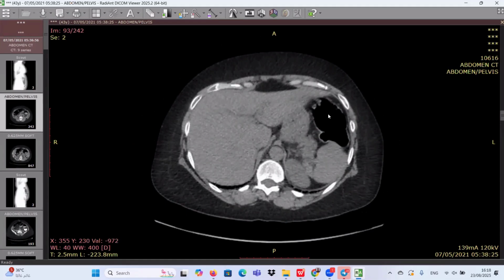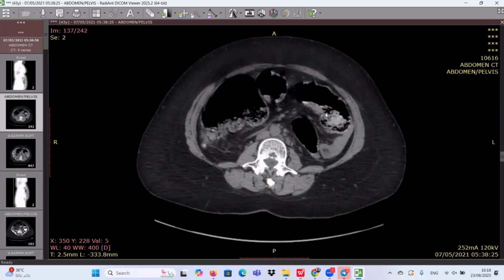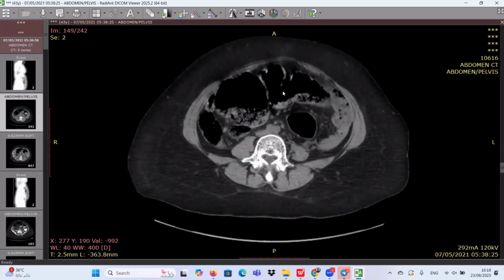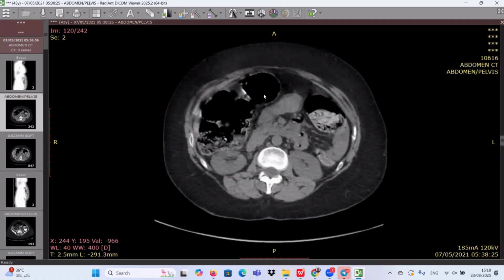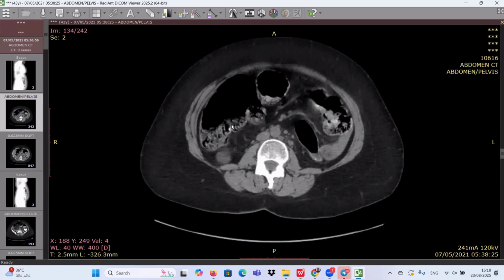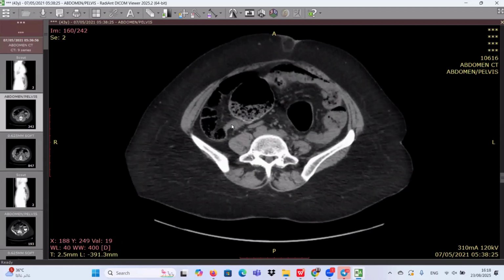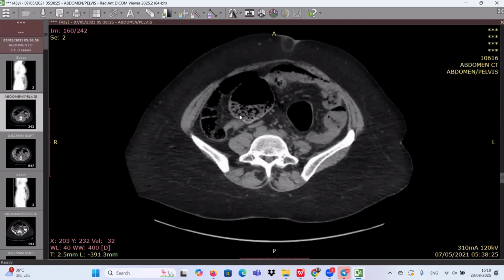Okay, sir. Now I'm in the transverse colon. Yes, you are right. We have a significant dilatation of the large bowel, more severe at the ascending colon and cecum. Yes, sir. Then, sir, the ileocecal junction, I'll comment on the ileocecal junction, which the appendix is normal, and so is the ileocecal junction. Yes, sir. Very good.